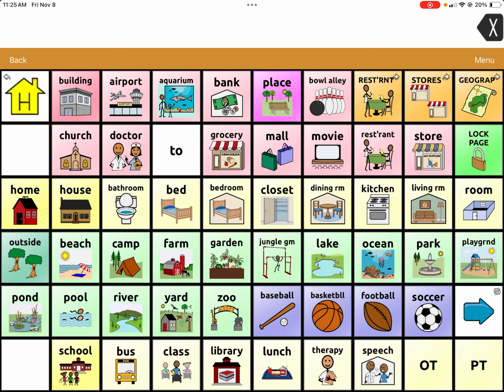And so that's from a Cocomelon song, and then they can tell you where they want to go. So blast off was their way of saying go, and you can tell them, they can say blast off. Bed. Blast off to bed, and that's really more of a stage 1 gestalt where it's whatever they're echoing from a show, from a song, from a movie, from your verbal speech that you've modeled for them as parents and as teachers and as specialists.